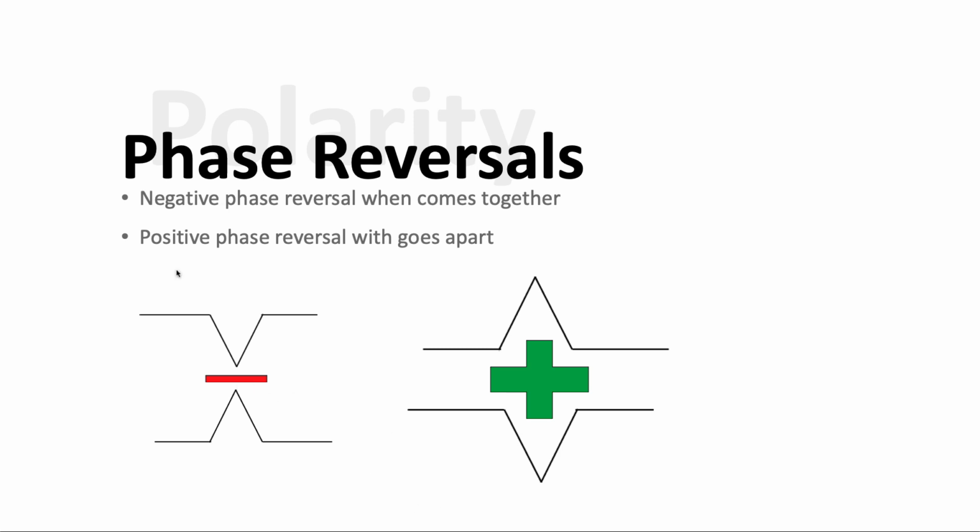So the first part of this waveform here is a positive deflection, and then the second part is a negative deflection. But together, actually, the polarity is a negative polarity of this discharge. It causes these to come together like this. And I'll show you why this is on the next slide with more of a 3D model of this. But just realize phase reversals and polarity are different than electrode convention as far as deflections go.